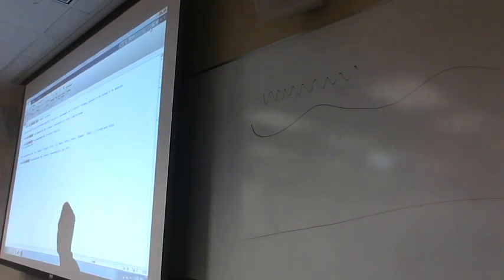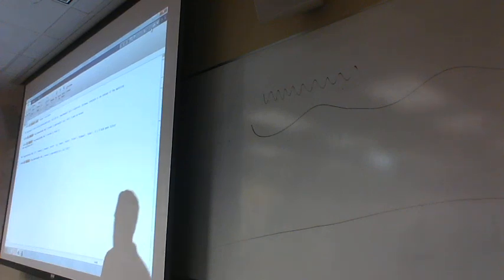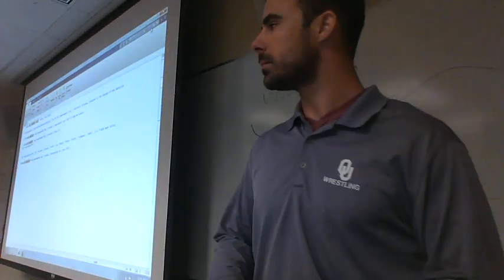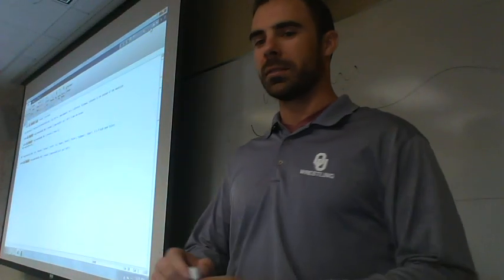Line 11. EEGH. Okay, I see. Make sense? Yeah, I have it.